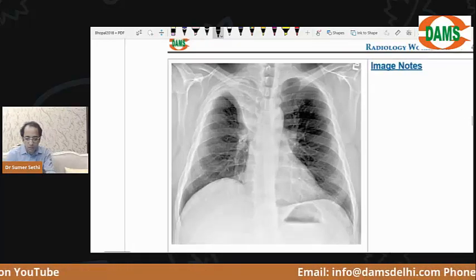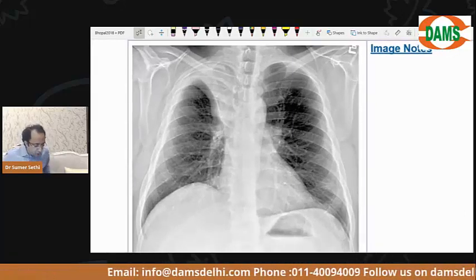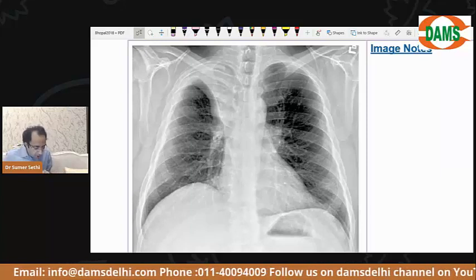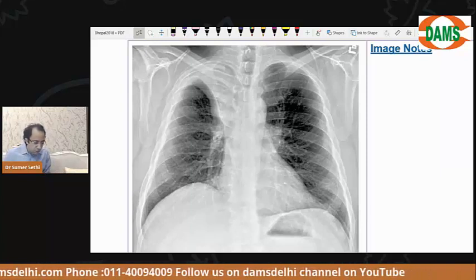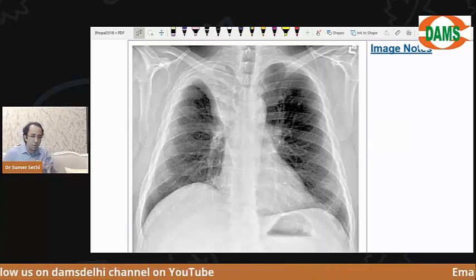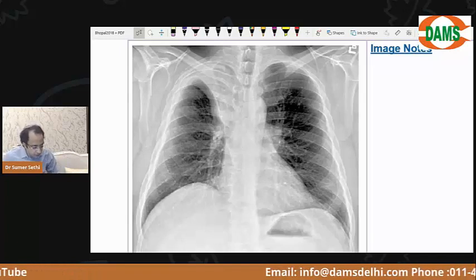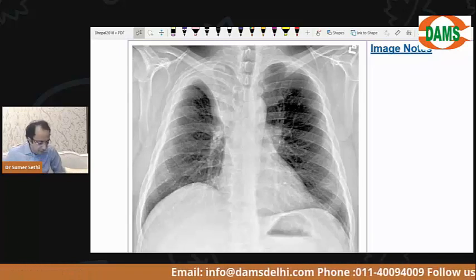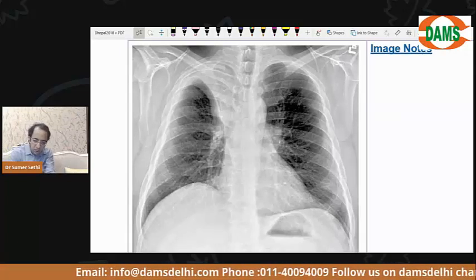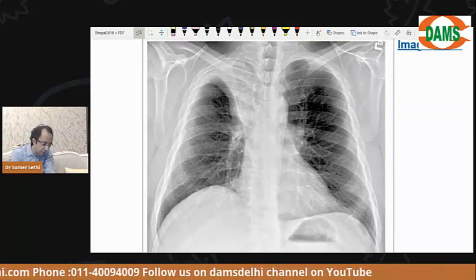So let's start evaluating the first X-ray together. So this was only to make sure that you understand. The key is, okay, I'm sure you have read about consolidation in your pathology also. जब उन्होंने बताया था, the lung becomes like gray hepatization, red hepatization. I don't know, आपने पढ़ा था कि नहीं? But let's see. Let's try and understand. Okay, let's see the first X-ray and try to understand, beta. Okay, let's see an answer.